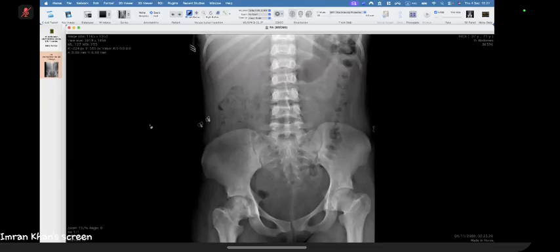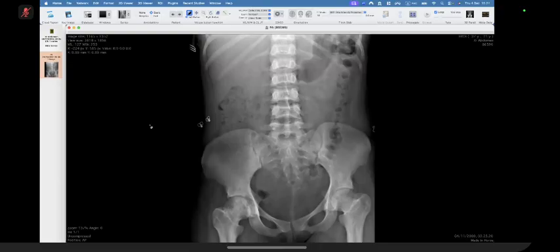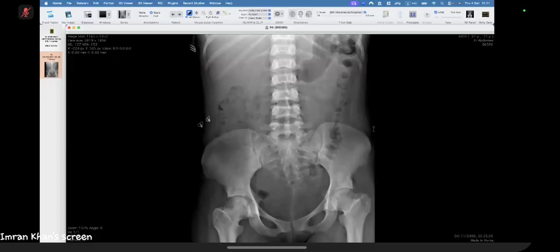Okay. Go on, please. I've been presented with a frontal radiograph of the abdomen, including the lumbar and lower dorsal vertebrae and the pelvis. The first thing that I can see is a patchy sclerosis and mild deformity of the right femoral head as compared to the left side. Also, the lumbar vertebrae have somewhat depressed superior and inferior end plates, giving an appearance of H-shaped vertebrae. Sacroiliac joints and iliac crests appear normal.